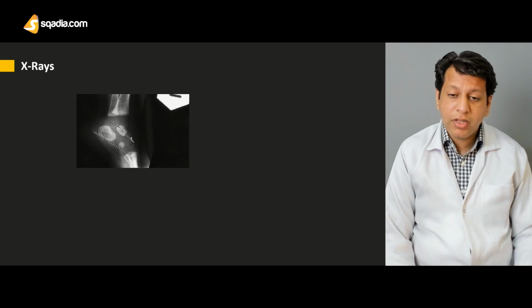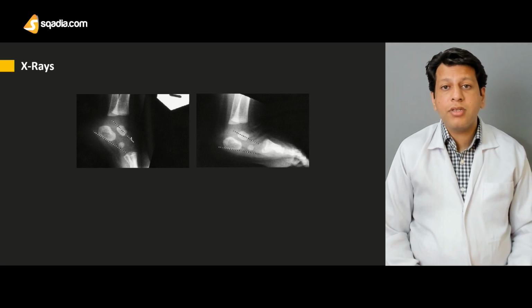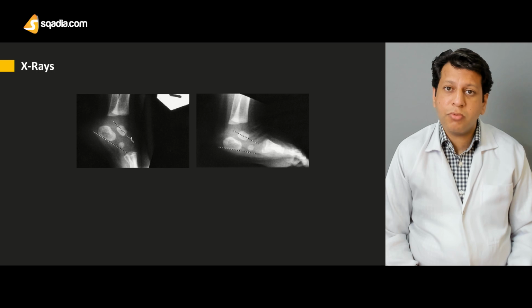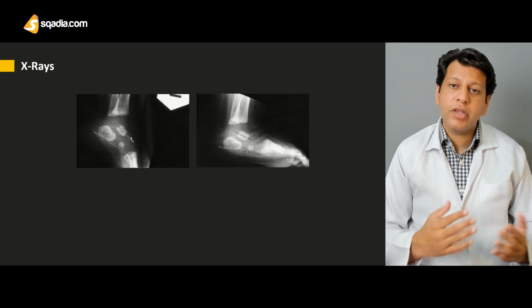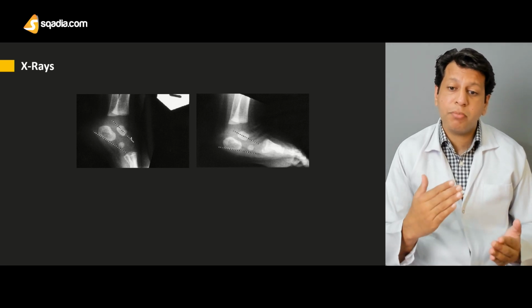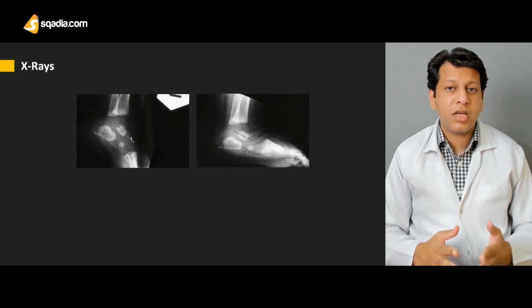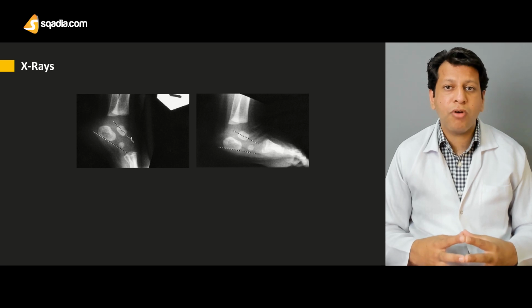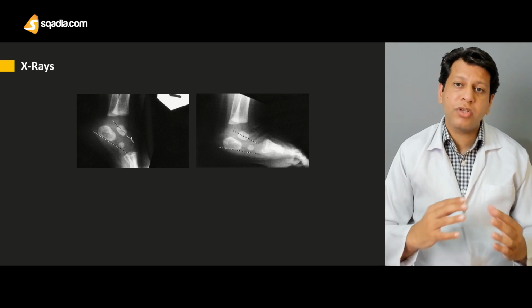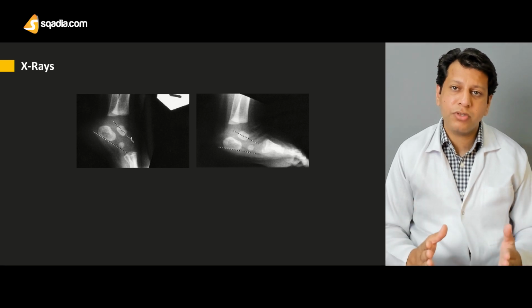We also have to calculate the talocalcaneal angle, and when we are calculating it, it's usually difficult because of the hindfoot parallelism. But if this hindfoot parallelism is not seen, then probably this is not congenital Talipes Equinovarus. It is probably CVT or some oblique talus as well. So you have to keep all those differentials in your mind along with the diagnosis.